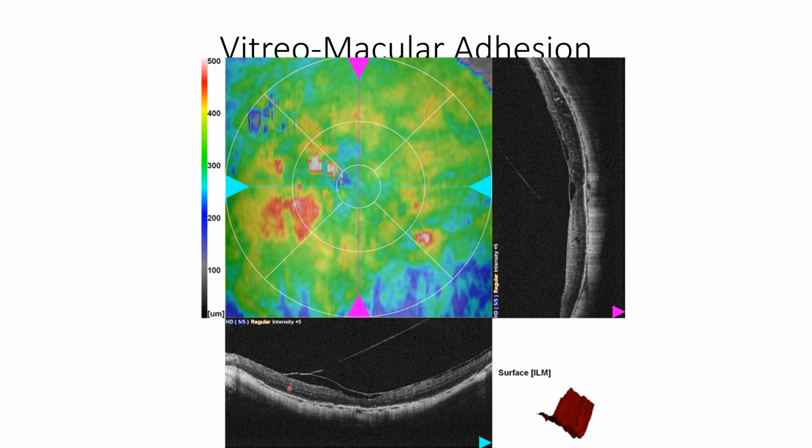And here we have adhesion of a fibrotic membrane, which is not causing much distortion, but there's an adherent membrane here, which is adhered to a membrane in the vitreous as well. So this may cause distortion of the retina later on, although at this moment it is not contributing much to distortion of the retina. And the retina is thin also, as you can see. This is a myopic patient, and myopes have a thin retina at the posterior pole.